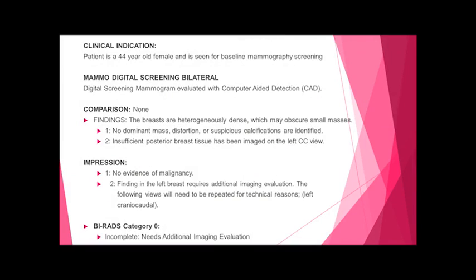All right, here's another example of a screening mammogram. Patient, 44-year-old, is a baseline screening. Insufficient posterior tissue on the left CC. Finding: left breast requires additional imaging. The following views need to be repeated for technical reasons. Left CC. BI-RADS 0, needs additional imaging.